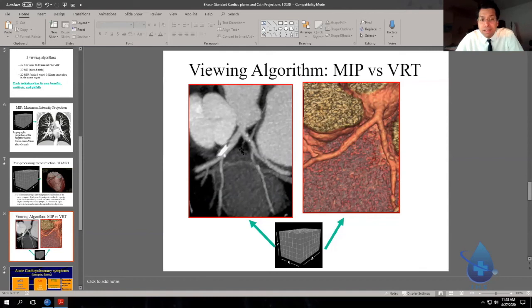It's in the paper on coronary veins, but these were the pathologists that first described it. And there was a large series that came out a year and a half ago on the triangle of Brocq and Mouchet of cadavers, because people have been snaring the triangle, putting in Watchmen. You may not realize what hangs right over that triangle of Brocq and Mouchet is the left atrial appendage, okay? So the floppy dog ear of the appendage lays right over that triangle. Let me show you where it is on the 3D workstation.